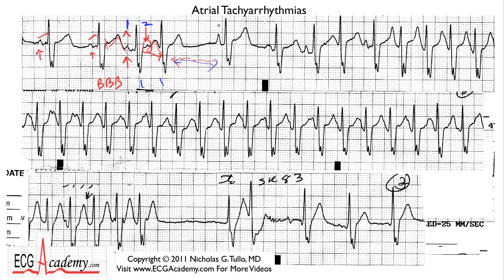You have a very tall P wave here, and some people would call this an escape beat since the P wave looks different morphologically than the sinus P wave. But then this looks more like a sinus P, and we're back to a rate of about 70. And then we start to see another APC, and maybe this is an APC as well that conducted to here.